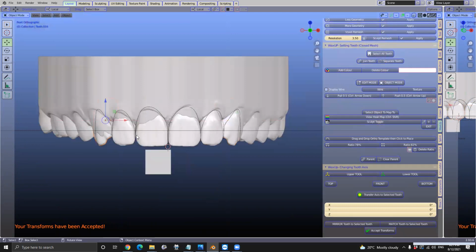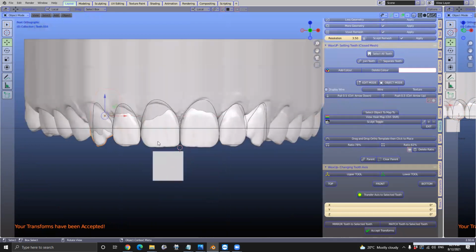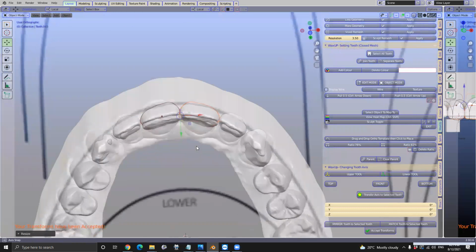Okay. Wolfgang, you mentioned those teeth are too pointy. Yeah, I think so, and you can change those. So these 2 we're going to bring up a bit. And these 2, I'm going to just scale this just a little bit like that. So that's looking quite good.